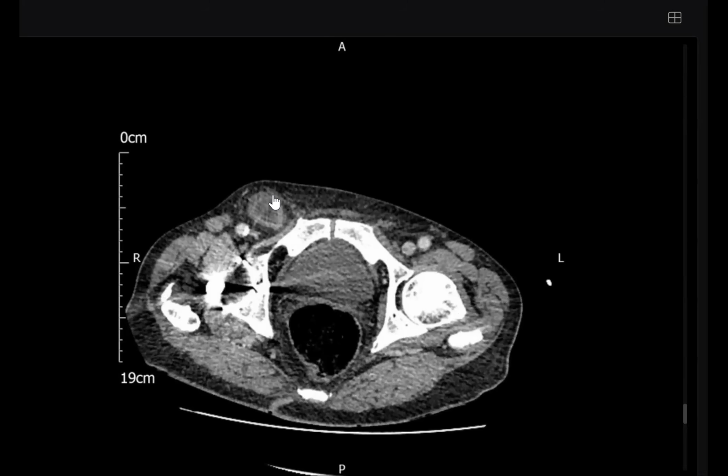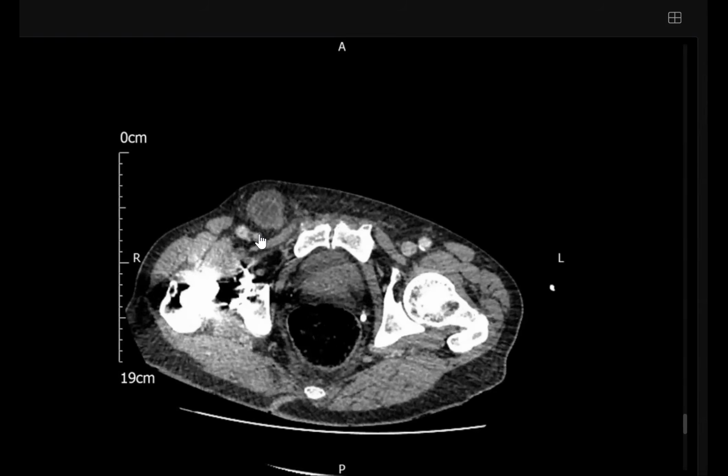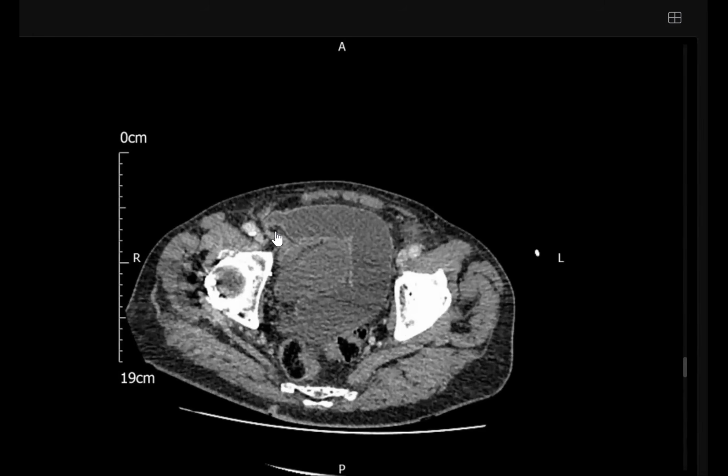So this is definitely a femoral hernia. It's femoral. The most sensitive sign, in addition to lateral to the pubic, is the compression on the femoral vein. Femoral vein, its size either similar or larger than the artery, not smaller, not collapsed. So it's definitely a femoral hernia. This bowel loop containing fluid and the hernial sac also containing fluid. So it's an obstructed femoral hernia.